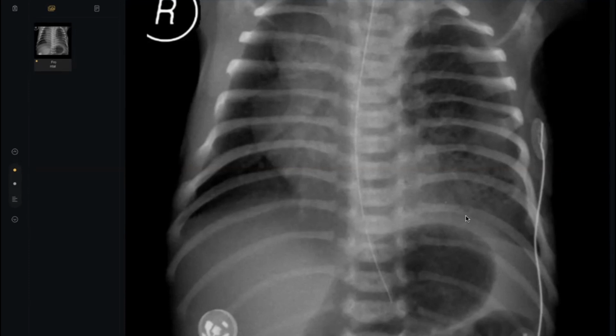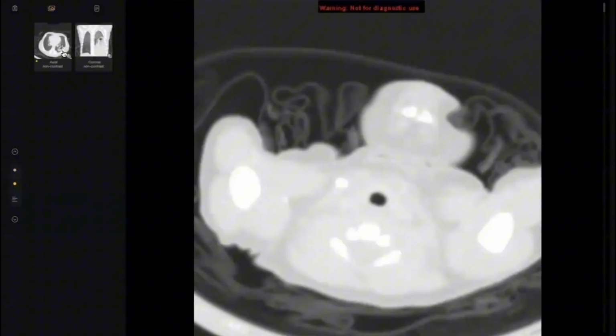I will inform the findings to the referring physician, and will suggest further imaging in the form of ultrasound, first of all. And what else? Then CT with contrast to see the vascularity, anomalous vessels, anomalous blood supply of this. Scroll, please.